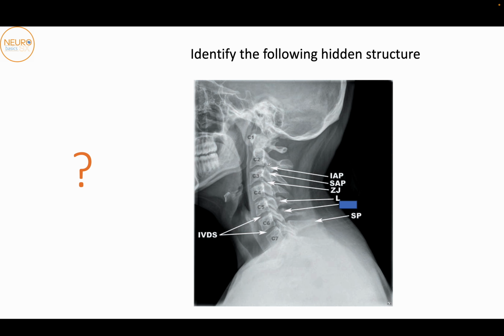So this over here is the pars interarticularis with the inferior articular process, the C3 pars interarticularis with the superior articular process, and this is the facet joint. So you can see its angulation over here. This angulation becomes important when we're trying to place a screw intraoperatively. This is the zygoapophyseal or the facet joint. Okay, then this area would be the lamina, this box, and this is the spinous process. Okay, so this, as mentioned correctly, is the spinolaminar junction.